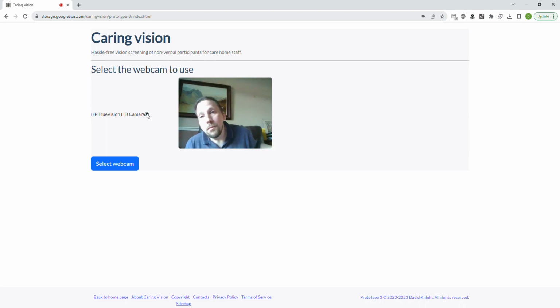Whilst I'm on screen, I'm going to show the other equipment you're going to need. You're going to require a credit card size object. This is just a little card, NHS card, so you're going to need something this size. And you're also going to need some kind of measuring device. I've got a tape measure. This tape measure comes with two scales. It comes with an inch scale there, which is the larger of the two scales, and it's got IN written on it, and a centimetre scale with CM written on it. That's the smaller of the two scales. Each of the individual markers on the centimetre scale is 1 millimetre, which we're going to use later on when we're going to measure the size of the chessboard squares.